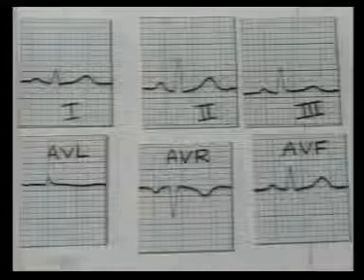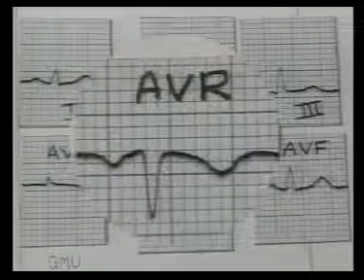An electrocardiograph must be studied systematically, step by step, so that even minor changes are not missed. Here I have presented one way or order of reading the electrocardiograph. With practice, you may develop your own order of observation, but the important thing is not to miss out on any point. When you read an ECG, first inspect lead AVR.